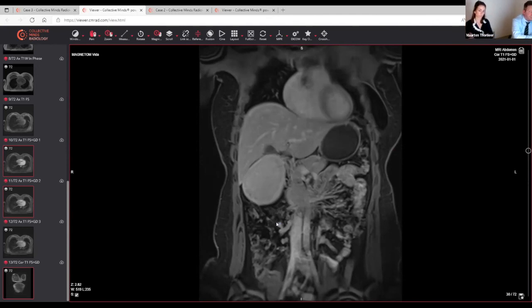It's known from literature, from a publication in France, that more than 90% of the adenomas are homogeneous in subtype. So there are some seldom cases which can be heterogeneous, like in this case. So I don't know if this could be helpful to guide the biopsy. Okay. Yeah. So any other thing? No, I think this was our 3rd case.